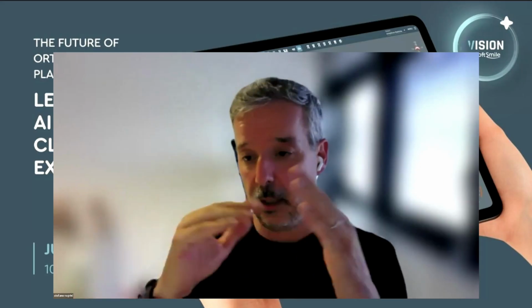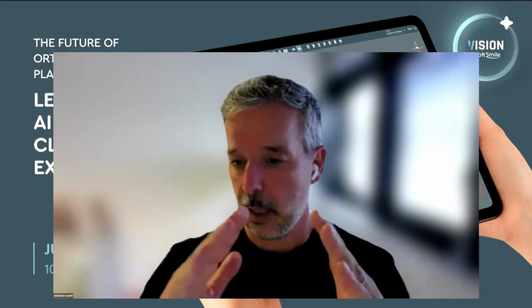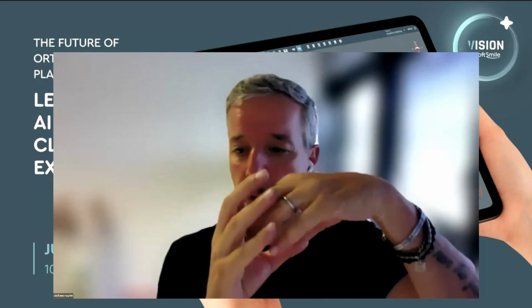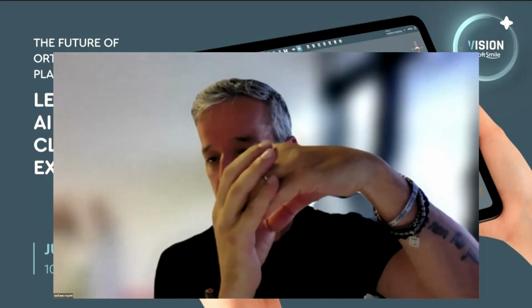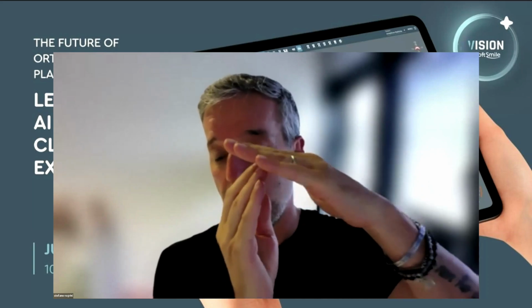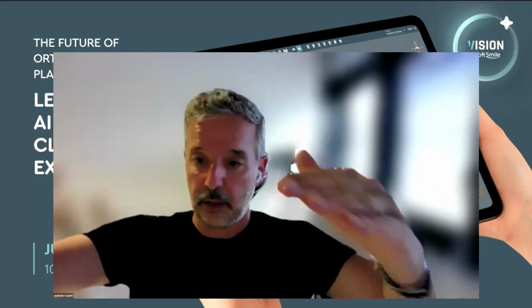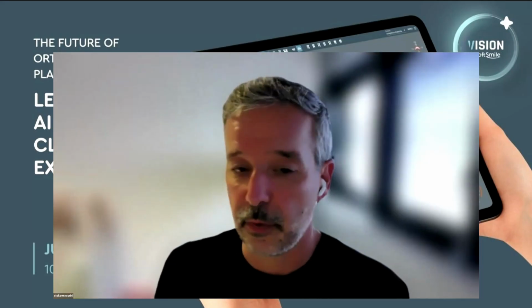Just for example, inclination doesn't need attachment, but sometimes when you change the inclination of the lower, you do need attachment, because step by step the engagement between the aligner and the surface of the tooth is not stable. You see some play, so you need to put attachment or increase the cutting line. Increase the cutting line means not scalloped, but just a straight line, 2 millimeters over the gingiva. You have the possibility to take off attachment.